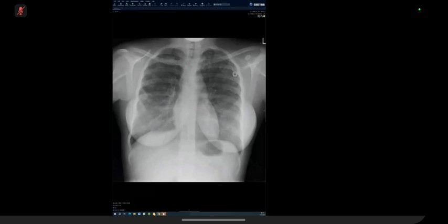Okay, I am presented with a frontal radiograph of the chest. There is no obvious abnormality that is apparent to me. However, I do notice that there is increased reticular nodular opacity in the periphery of the lungs bilaterally, and there is also, I forgot the name for it, the line for long-term portocath in situ.